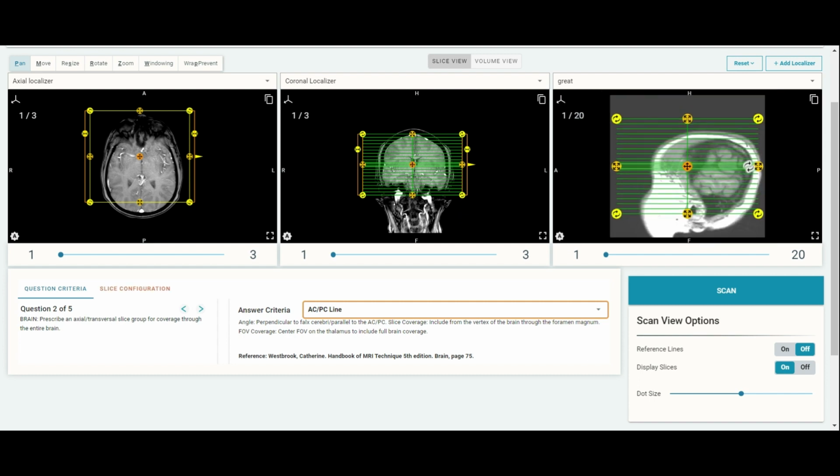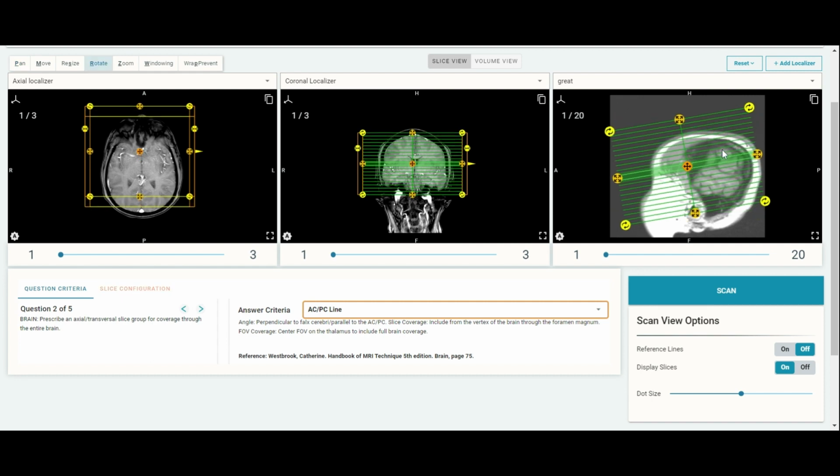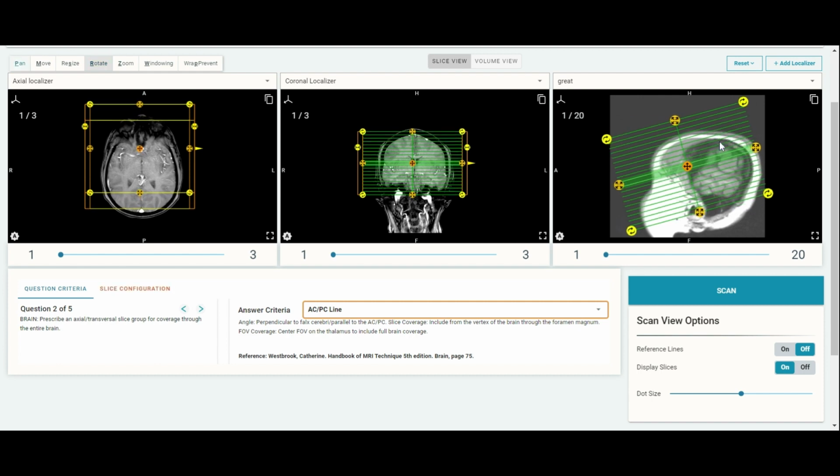One other piece of functionality that we have included in this mini upgrade is a new section here where, on this highlighted line, you'll see if you hover over, you've got these rotate buttons that you're usually accustomed to only seeing up top here in the corners. Now, if they want to angle directly with that line, they can go ahead and do that. They don't need to necessarily use the corner buttons. They don't have to, but it is an additional option just in case it's easier for them to do that angulation in this area instead of doing it from the corner.